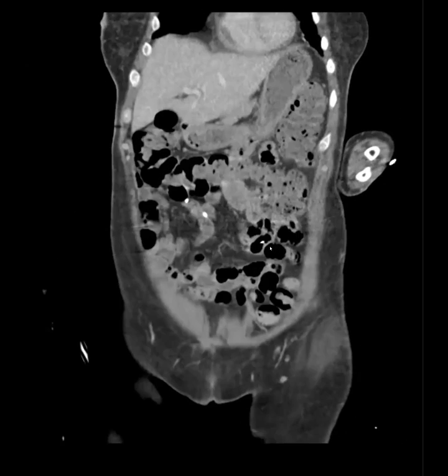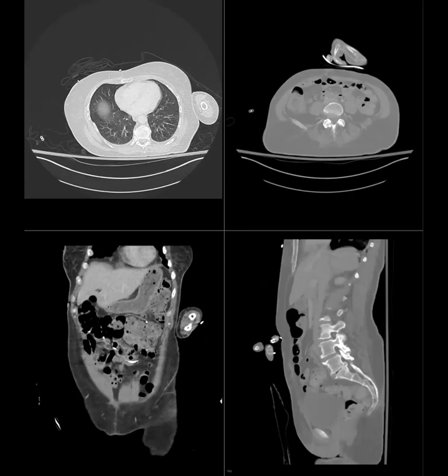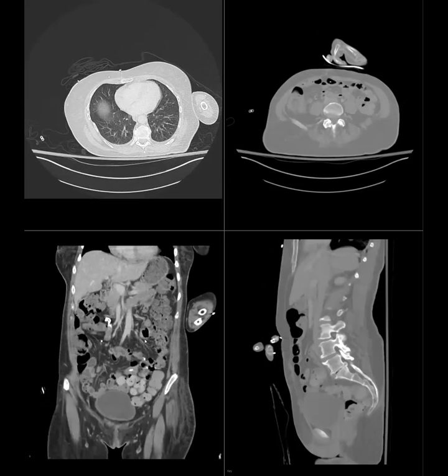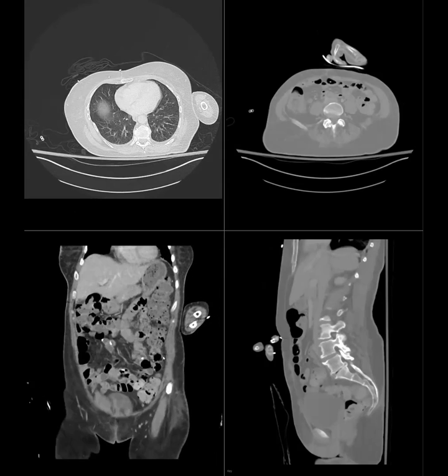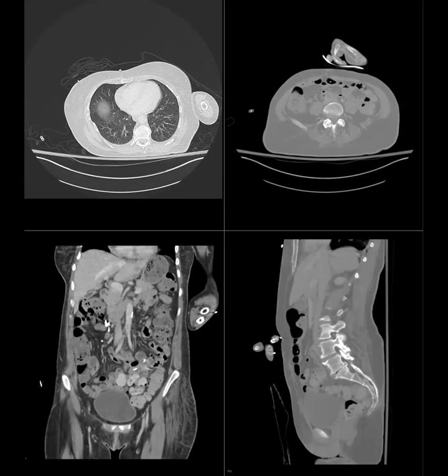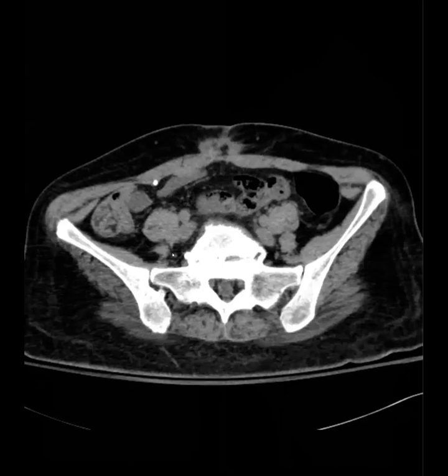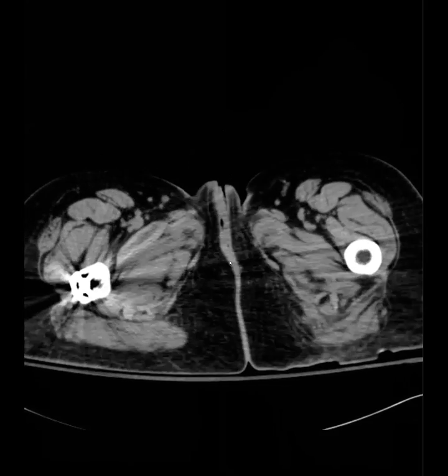The follow-up is they eventually had to do an exploratory laparotomy, pull it out, and lysis of adhesions. I think they did a short segment small bowel resection. The interesting part is that this patient, I think this was a CSF shunt revision from a prior one that had a complication. Here's that one, and if you follow this CSF shunt, it goes out the vagina. Oh my gosh.